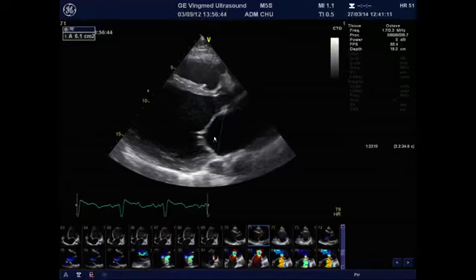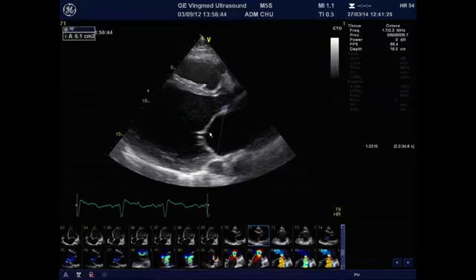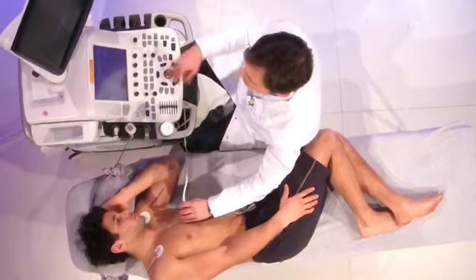mitral valve. The normal value should be less than 2, and in these patients, if we have more than 2 and 3, this is associated with a high likelihood of recurrent mitral regurg after any kind of valve repair in this patient. So if we want to continue the analysis of the deformation of the mitral valve, there are parameters that should be taken into account, and again, just to highlight this, 3 parameters should be taken into account.